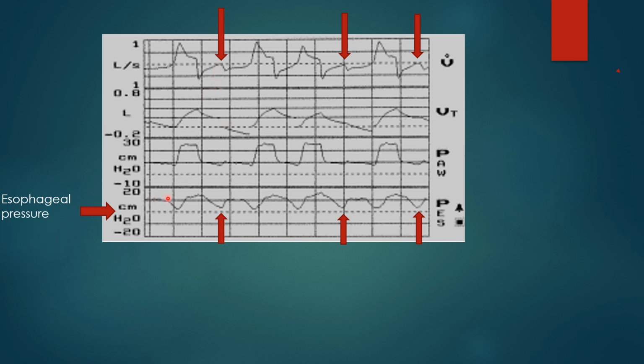You see, here's a patient's inspiratory effort, inspiratory effort, inspiratory effort. Well, when he made this inspiratory effort, he didn't trigger a breath, but he did make a very obvious inspiratory effort. And the same thing here, and the same thing here. So this type of dyssynchrony is uncomfortable for the patient. It's not helpful to the patient.